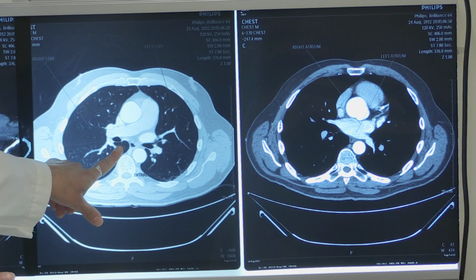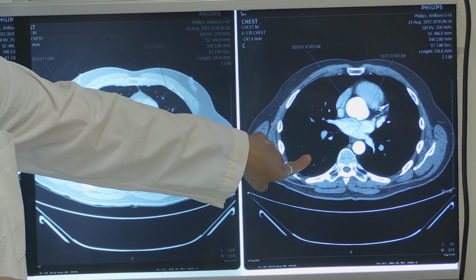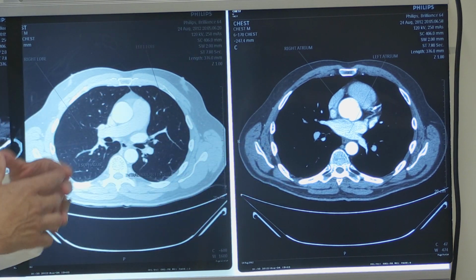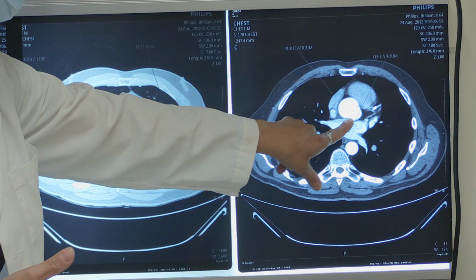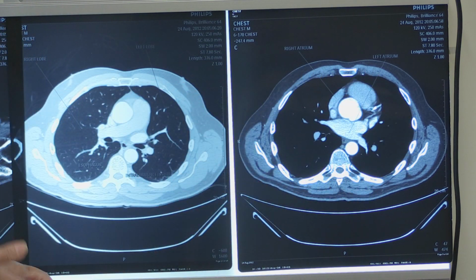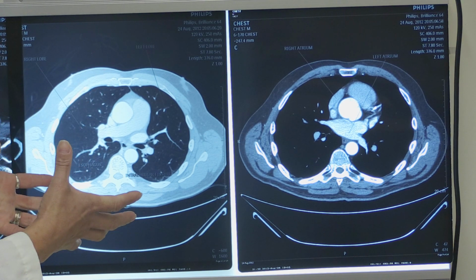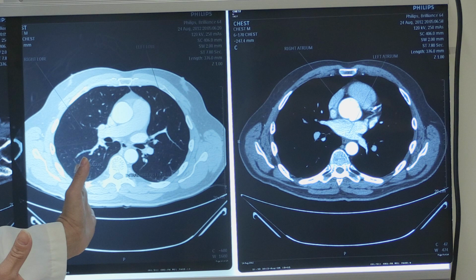Our focus right now is in the lung tissue. If you look at this image, however, the lung is just black. There's no definition, no detail. So in this case, we're looking at the vessels and the bones a little better. Again, you can change your windows to look at different structures within the same anatomy. That's why there is a difference between these two images.